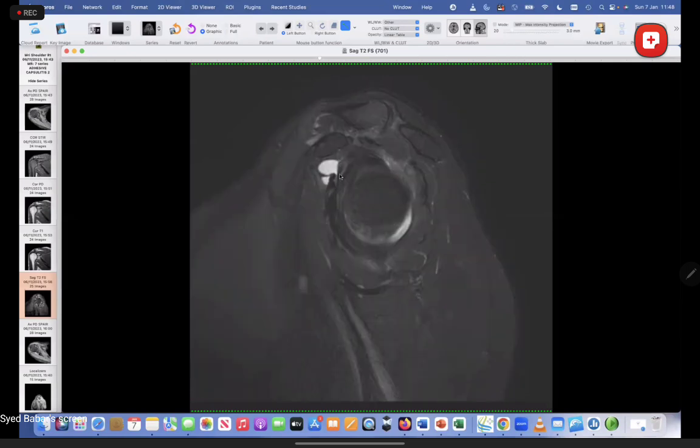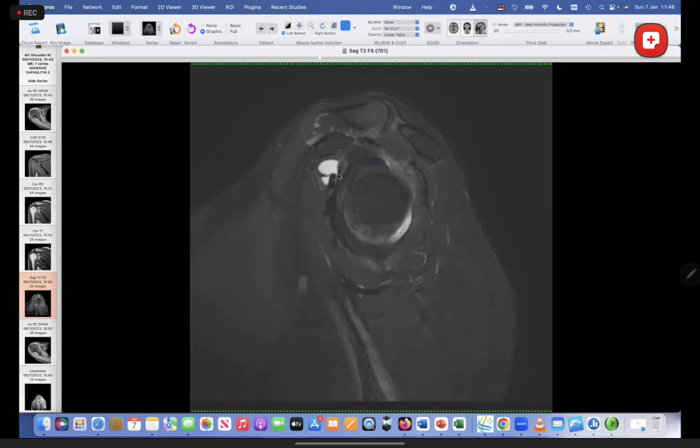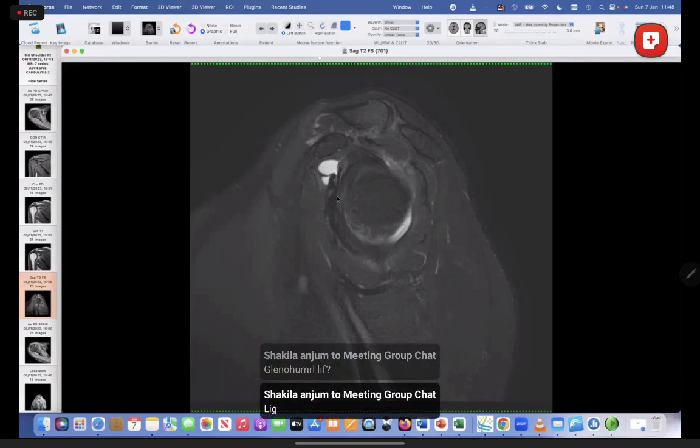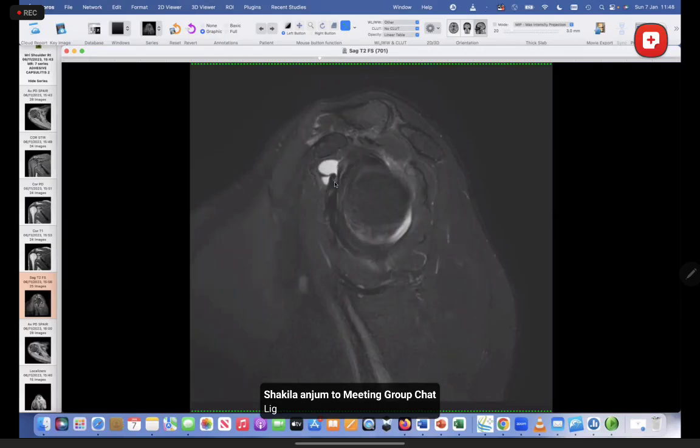So this is the middle glenohumeral ligament, the MGL, as you might have heard of. Remember, this is an intra-articular ligament because we're actually inside the joint here. Subscapularis is outside. This is inside the joint. So this is the middle glenohumeral. It runs parallel, but deep to the subscapularis.